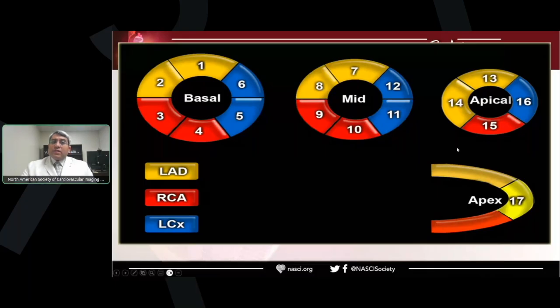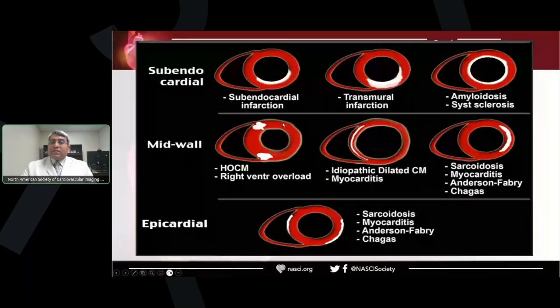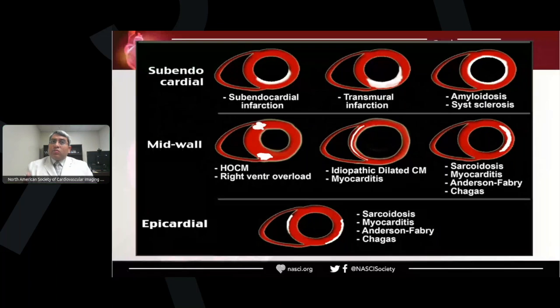This can show us that the different kinds of enhancement can let us put this enhancement in a short differential diagnosis list and start to go behind this. And if the MRI is not 100% diagnostic, we can go for endocardial biopsy guided by the MRI abnormalities.